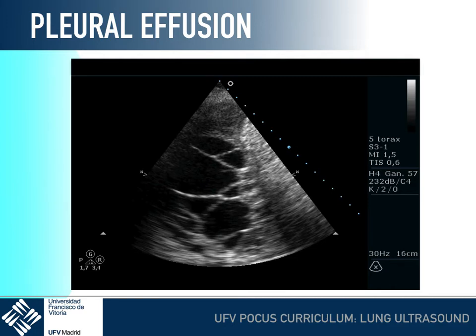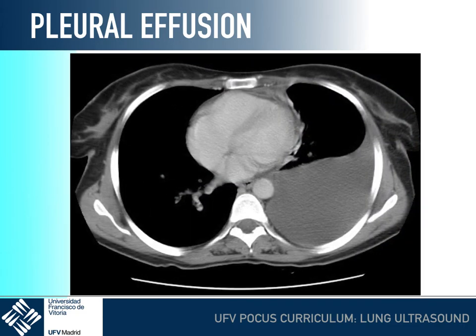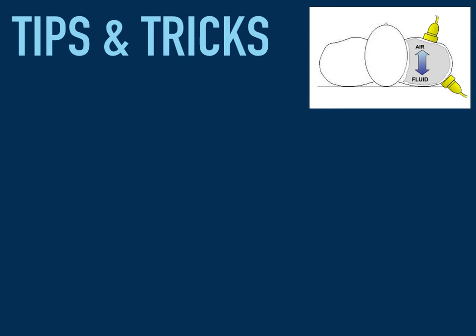So probably in this case, just taking a look at this pleural effusion, we already know that it's complicated for sure. Probably thoracentesis is not the first maneuver, the first thing we have to do to diagnose this patient. Almost all of them may not even be possible to distinguish with a CT scan.